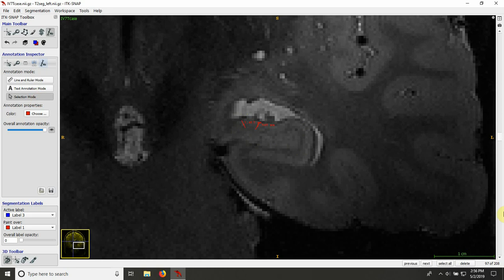I do want to point out that the thickness of these surrounding regions is not necessarily the same in every place. So it can be a bit thicker here inferior and lateral, and then it's often a bit thinner in these more superior regions. But it can be helpful to infer the location of SRLM based on the thickness of this CA region here.